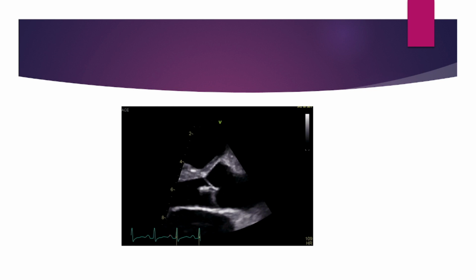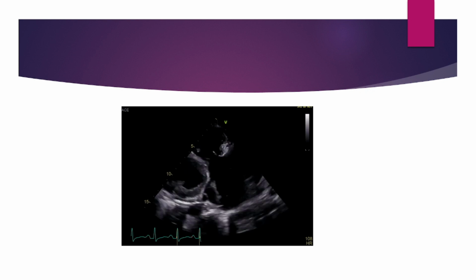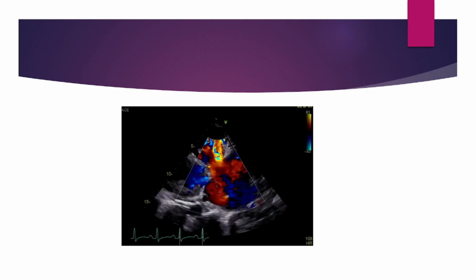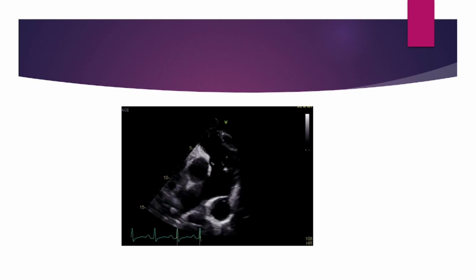This is the aortic vegetation. Also, there is poor coaptation of the tricuspid leaflets secondary to annular dilatation with severe tricuspid regurgitation. Plus more, there are multiple masses and destruction on the pulmonary valve. If you look carefully down, this is the aorta. Yes, this is the aorta. What do you see else? If you can appreciate this, you can see patent ductus arteriosus with a mass on it.